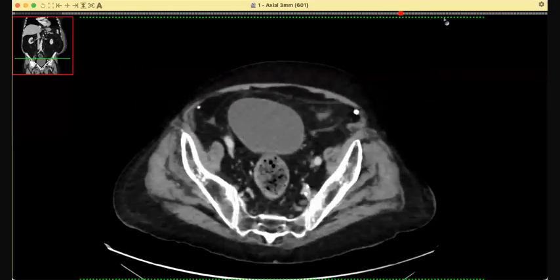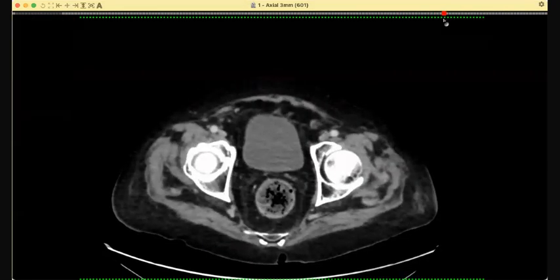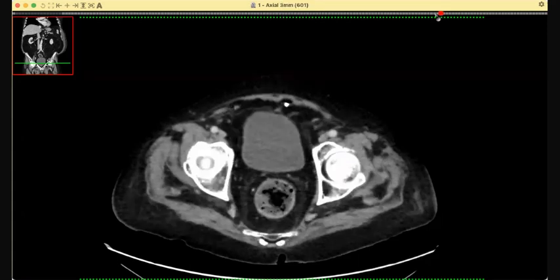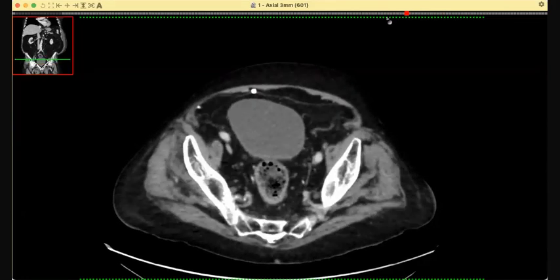Hint, you must be having a protocol for your abdominal CT. So you are looking at the soft tissue. Anything else you want to see? I would also look at the bony windows. So to look at the bone, please. Okay. On this window, look at the bone.